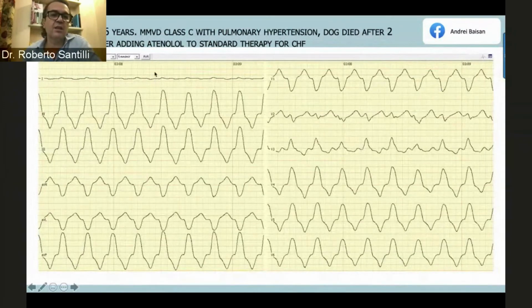And here is again the tachycardia. That was a focal atrial tachycardia conducted with truncular left bundle branch block, but it's not an aberrancy, because we also have wide QRS complex during sinus rhythm. Obviously, when you have an AV block or a bundle branch block, and you have the presence of sustained fast rhythm, then you can also have more bundle branch block. So there is a kind of aberrancy on top of an anatomical block.